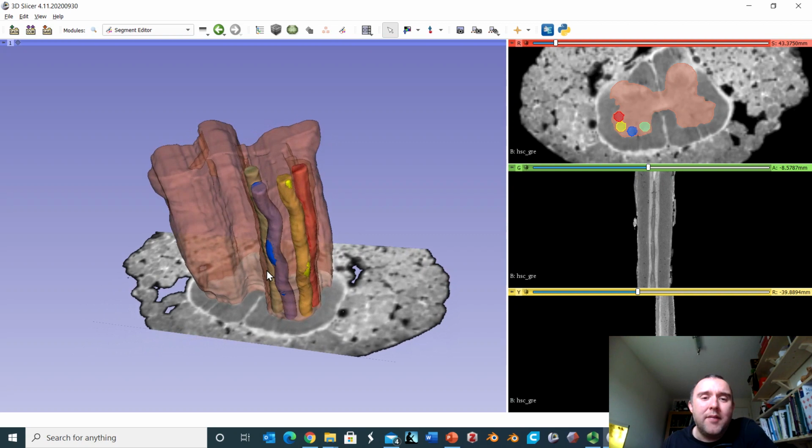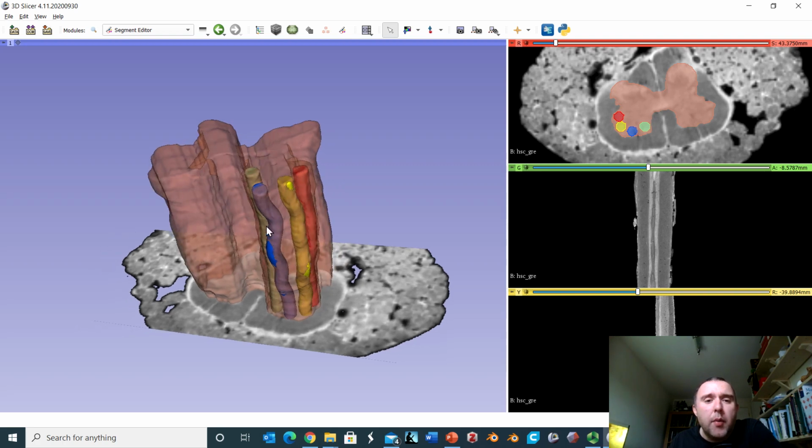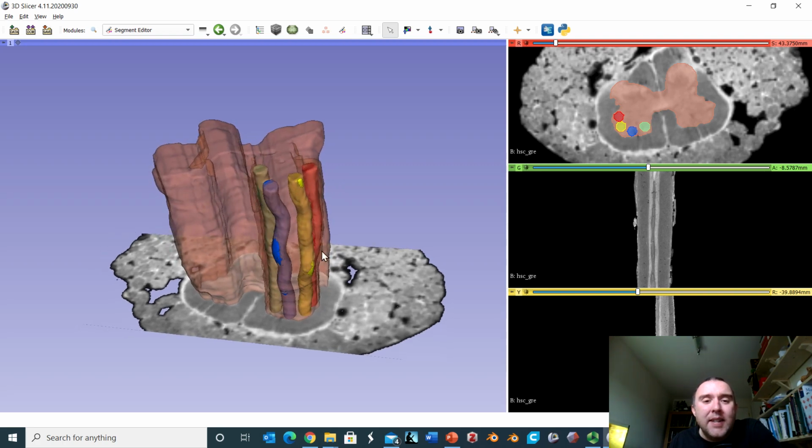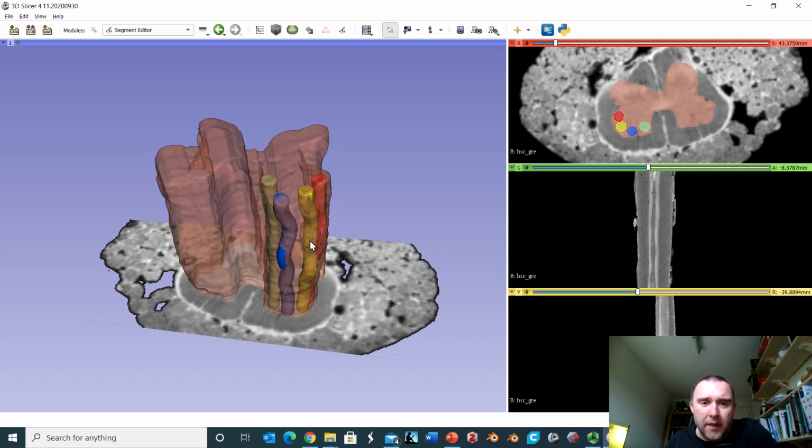And we can see that very, very nicely here. I've just segmented this out, and I've only focused on the one ventral horn, but of course it would be the same on the other side. So we can see that we have columns of cells, columns of lower motor neurons supplying different distinct regions of the limbs. This can be clinically important, but in my teaching I don't linger on that too much.